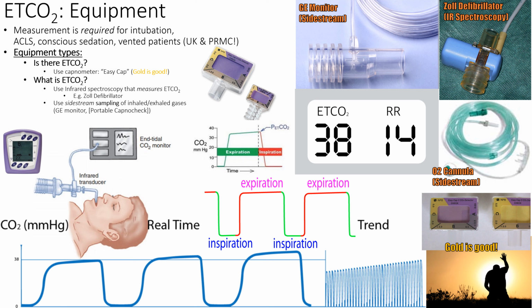All right, what equipment do you need to measure end-tidal CO2? You can just do a check, like the CAPNO check, right? This guy right here. Someone wants to nominate who's going to breathe into it, but first of all, let everybody see it first. Don't just breathe into it and pass it. Don't lick it and pass it, please.